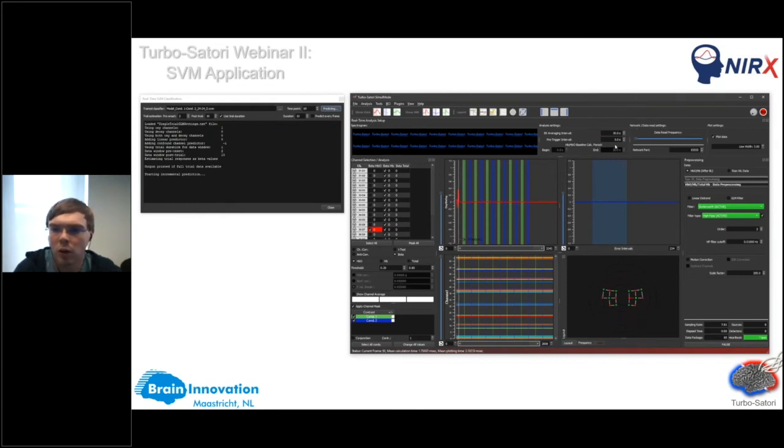But for this webinar, we just use the offline way. So now you see that the data is coming in, and the classifier is now using the trial duration to predict the specific condition. So it can increase the speed a bit.